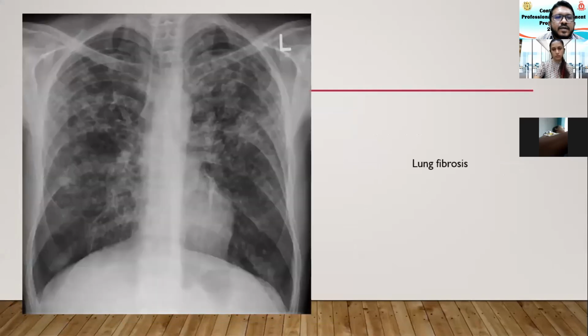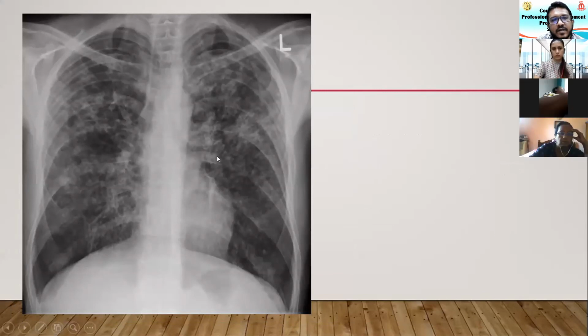In pulmonary edema, you will see interstitial thickening and peribronchovascular thickening as well. These are interstitial thickenings. But in fibrosis, if you look at the heart, there won't be any changes, there won't be upper lobe blood diversion, and there won't be any pleural effusions. As I said, there are certain things that you would see in heart failure which will be less or minimal in fibrosis, except for interstitial thickenings. In fibrosis you will end up having a loss of volume in the chest X-ray, and they are usually symmetrical on both sides.